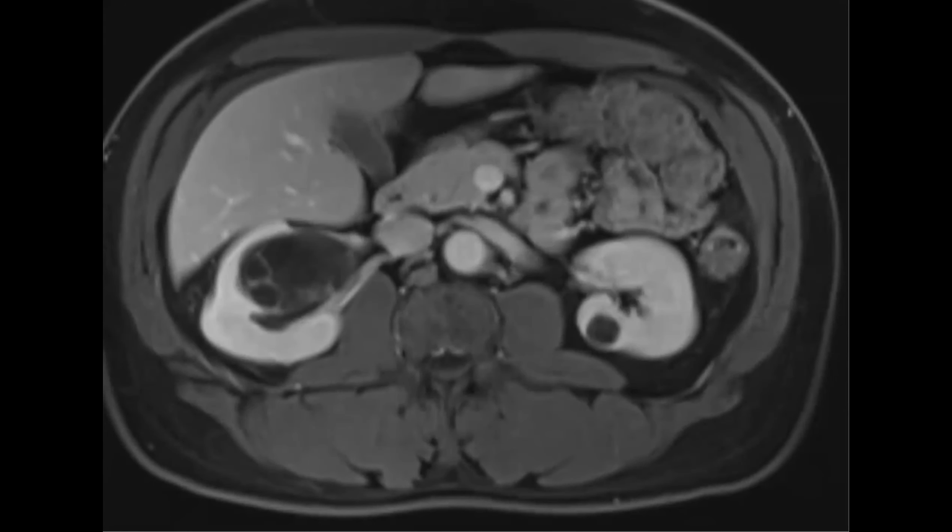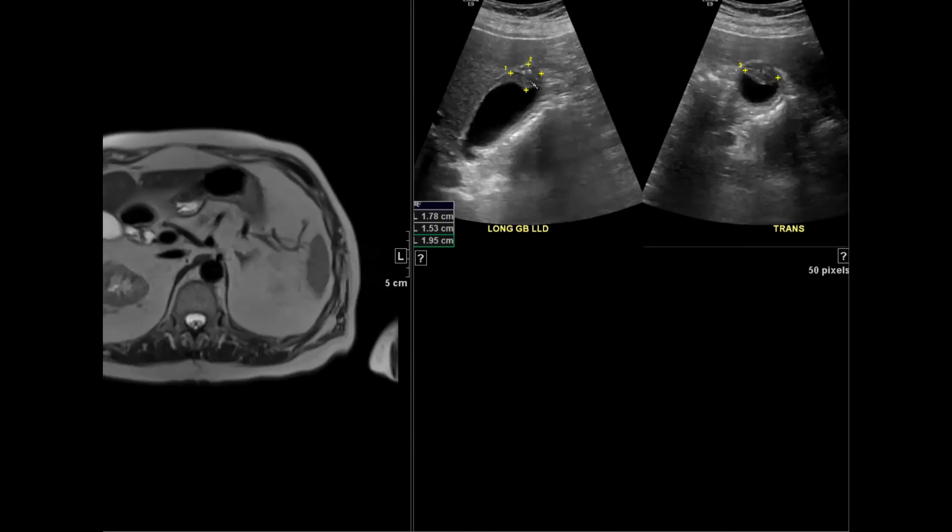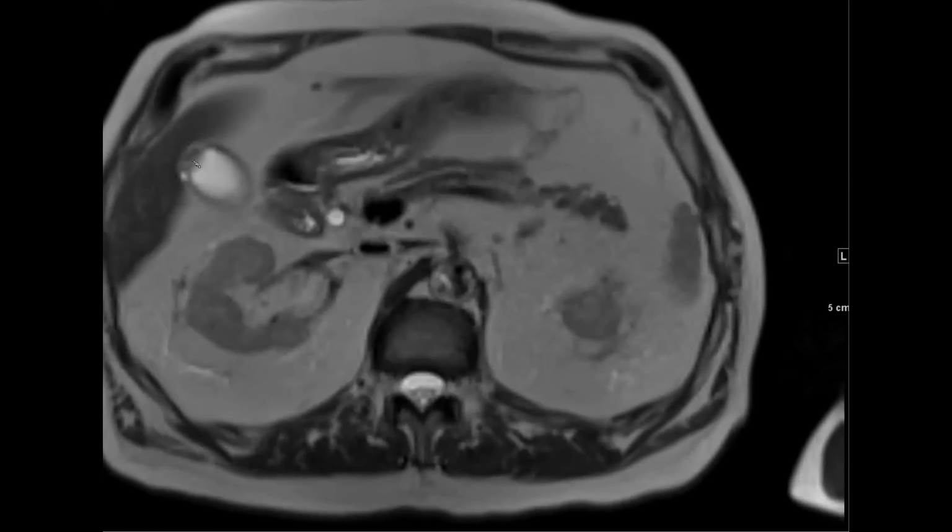And I had one more quick case to show you guys quickly. Okay, I'm going to try to show this ultrasound. I'll just focus on the upper quadrant here because I don't want to show any more of the ultrasound. Do you see that there is a lesion in the fundus of the gallbladder? It's got a couple of little echogenic foci in it, and it looked mass-like. So we said this could be fundal adenomyomatosis or a gallbladder malignancy. We recommended MRI. And then this was the MRI.